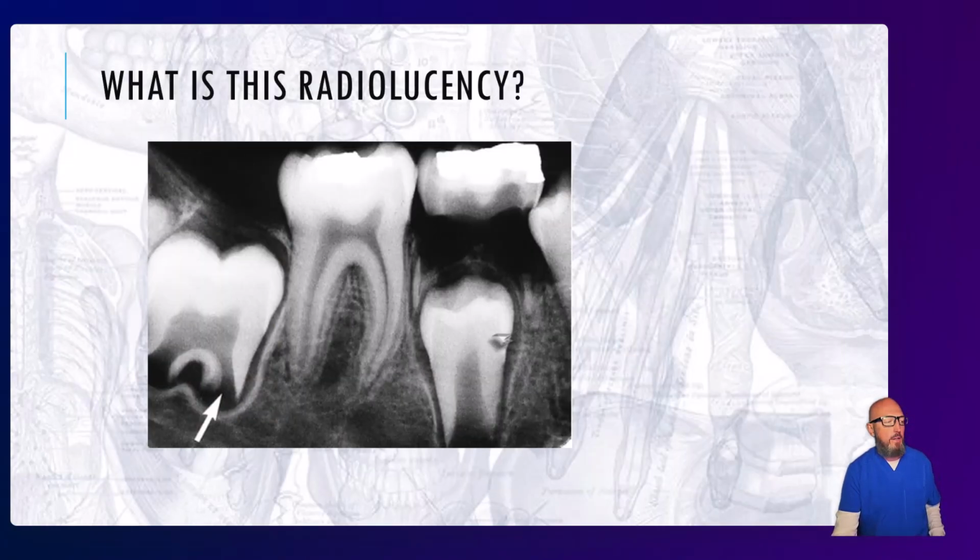All right, last thing here, don't make this mistake. Is this a periapical inflammatory lesion? Do you expect to see that on a tooth that hasn't even erupted? Probably not. I did see on a dental internet forum when someone was asking, why do these teeth have periapical inflammatory lesions? They're not even exposed to the oral environment yet. Or is this some other pathology?